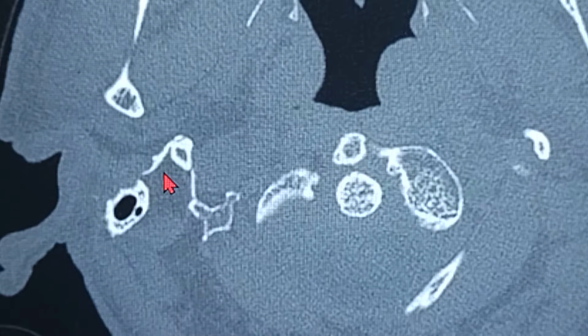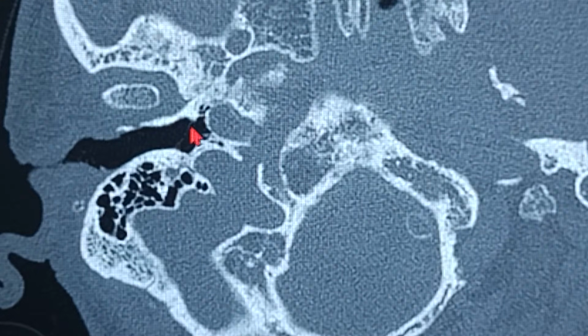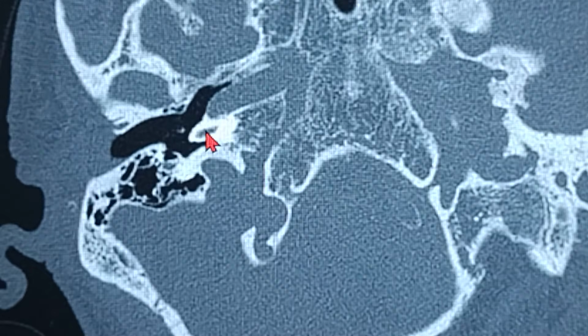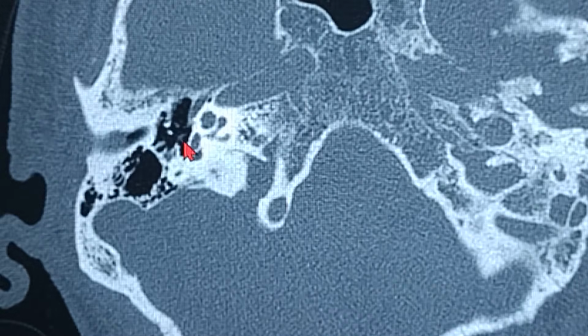That's the lowermost area. As we come up, you're going to see the tympanic membrane. You're going to see the ICA, the first basal turn of the cochlea, right here. As soon as you see the cochlea, you see the round window. You keep on going up, you keep on going up. You're going to see the stapes over here. Then this is the sinus tympani, and there you can see a glimpse of the facial nerve. That's basically the mastoid part of the facial nerve going vertically downwards to exit from the foramen.